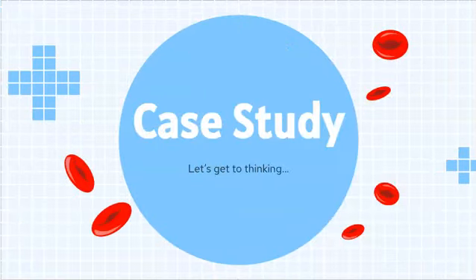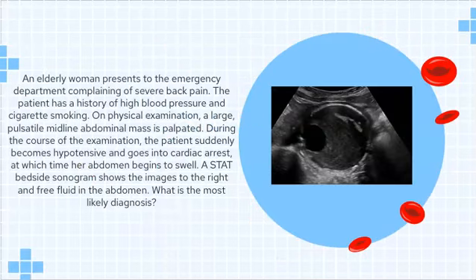All right, so let's get our noggins thinking for a minute. We're going to start off with a case study. We have our image right here, and then I'm just going to read the patient's history.